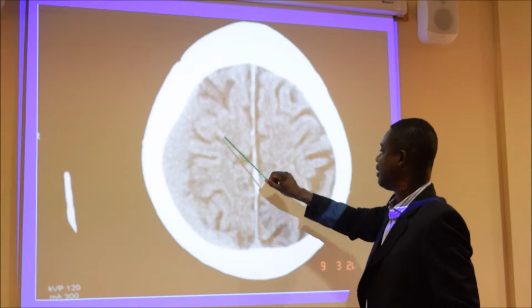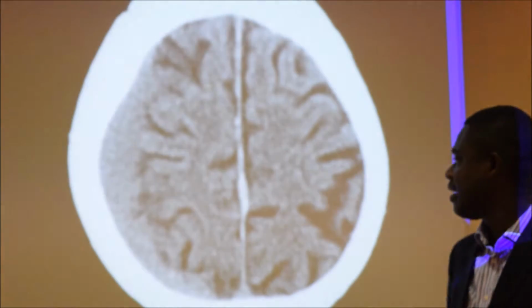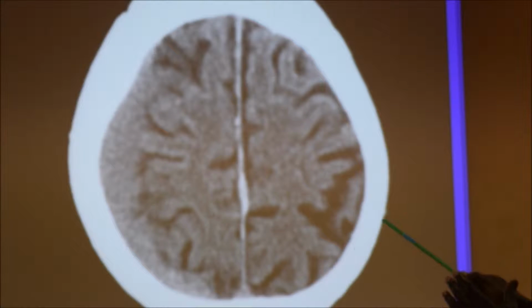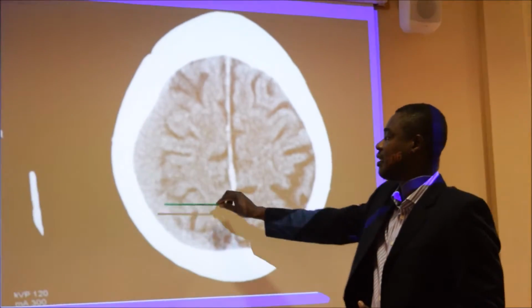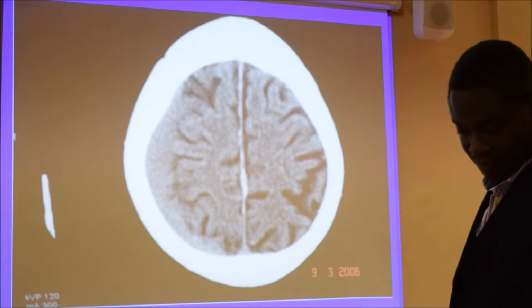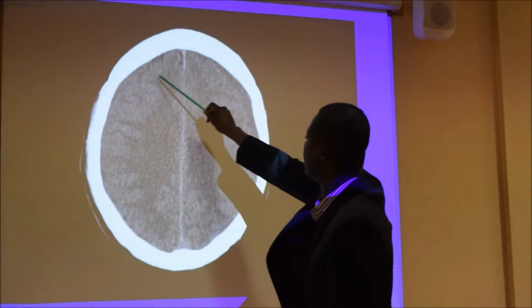So in this patient, for instance, that all looks very gray. But then if you look closely, sometimes the gray areas there may be different from the gray there. This is a patient with, does anybody know what this condition is? Very important to recognize this, because this patient is actually bleeding into the brain, but the blood is, if you like, trickling into one of the spaces in the brain very, very slowly, and therefore you're not getting time for it to show the classical density that blood sometimes shows. So this is a subacute subdural hemorrhage in the brain, and sometimes it can be very, very subtle, as in this case, where the subdural hemorrhage is there and there as well.